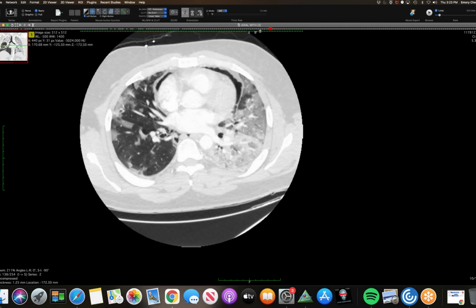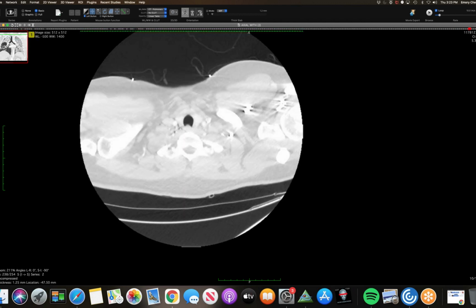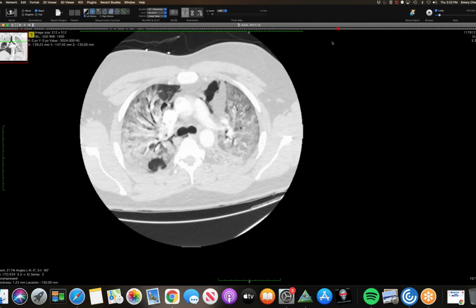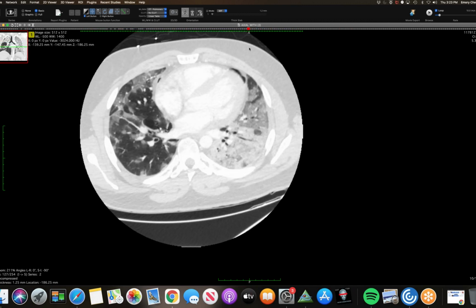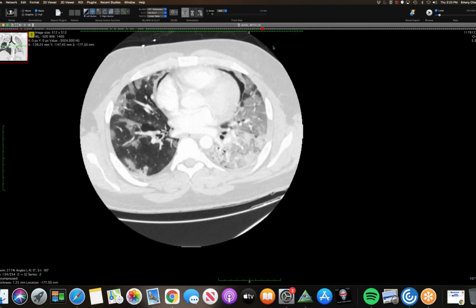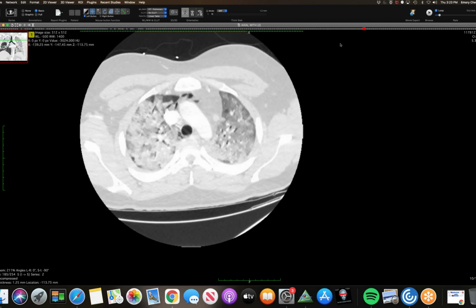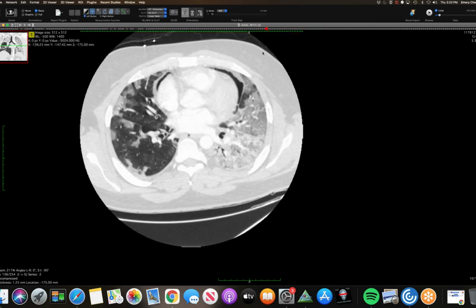The interesting thing is that I talked to the clinicians. This wasn't from line placements or anything like that. The patient hadn't been intubated. So this was interestingly from BiPAP, most likely from the positive pressure from BiPAP. Typically, we've seen this quite often from invasive mechanical ventilation with positive pressures, but BiPAP can also do that, less commonly.